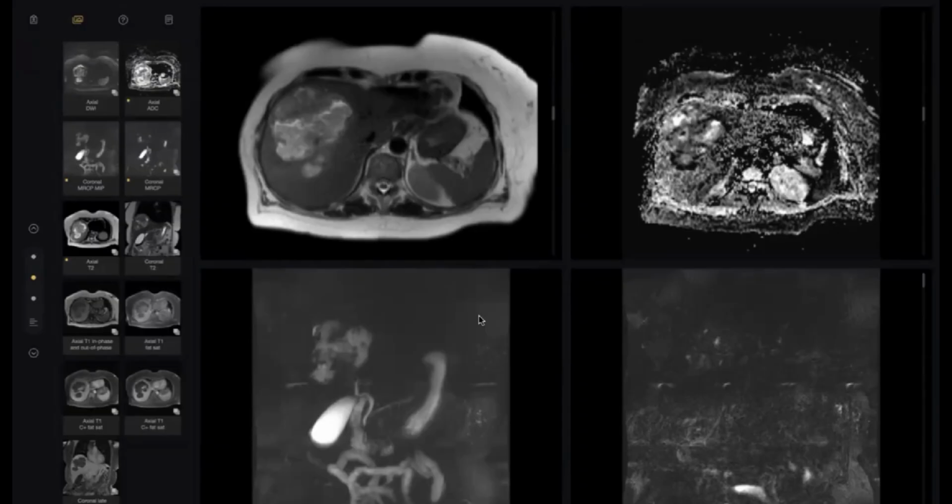The buzzword in tumors is packed cells. What is meant by packed? Compressed cells. That is the second cause. So number one, abscess. Number two, tumors, especially aggressive tumors, because they contain packed cells.